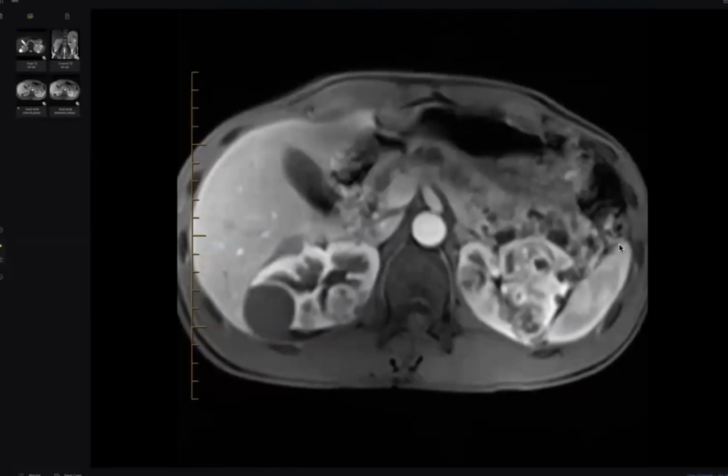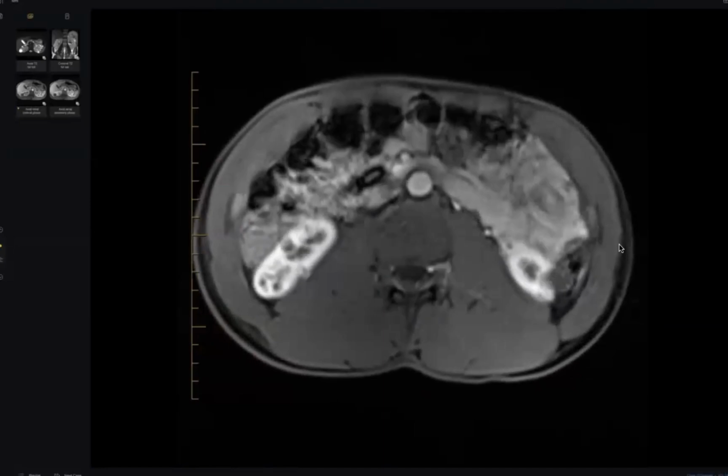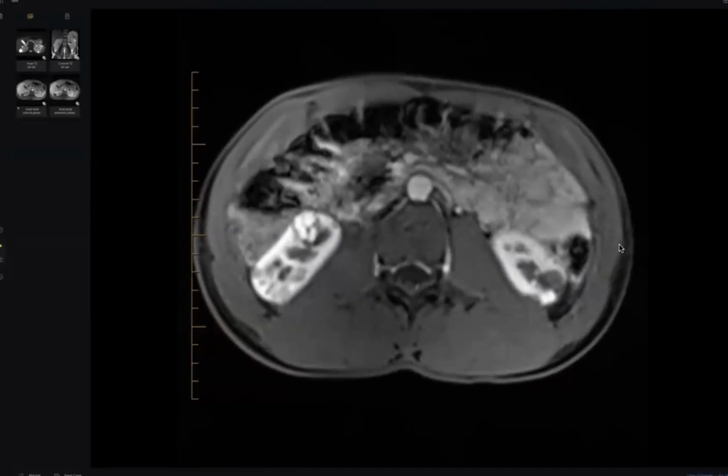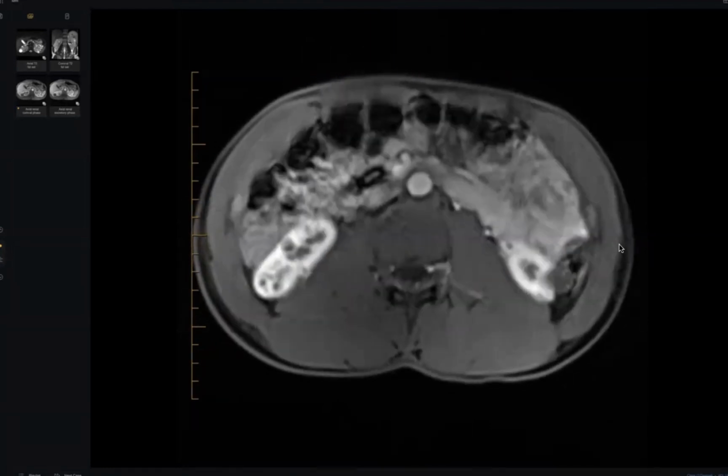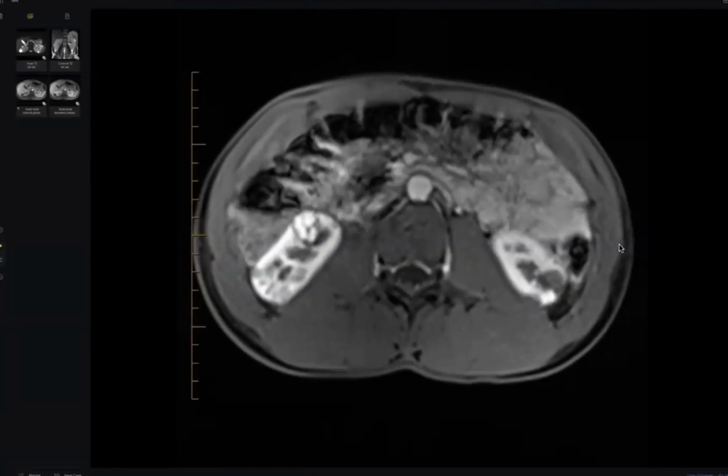Yeah, go on. Okay. So, sir, can I see the coronal images, please? No, look here. What happened here? Okay. So the paravertebral soft tissues appear prominent, and I can see the right kidney shows altered signal at the anterior aspect. What happened, doctor? So this is high signal. This is an enhancing lesion. Excellent. So this is suspicious for malignancy.